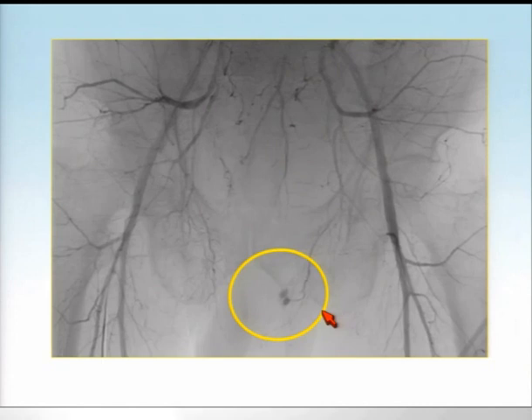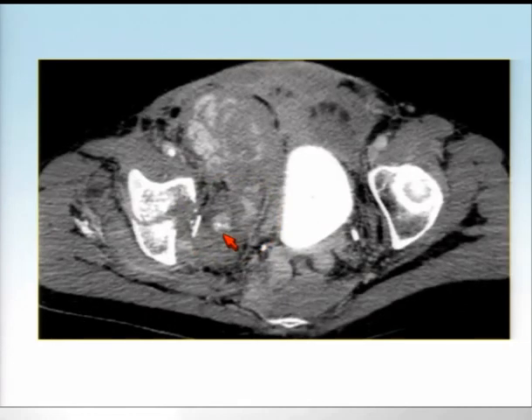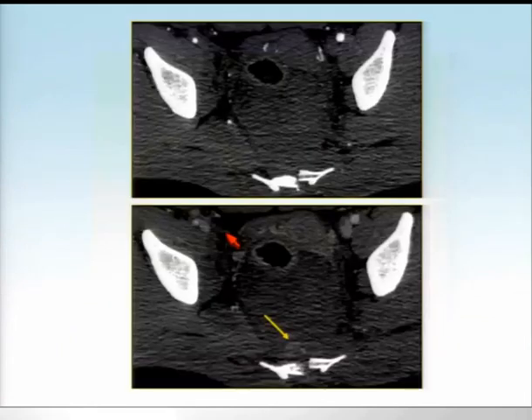This patient was successfully managed with embolization given ongoing arterial hemorrhage. Another case, similar injury on the contralateral side, again, really significant. This is a significant amount of extravasation at 25 seconds after contrast injection, and you can see that enlarge on the portal venous phase. And this patient also successfully treated for several sources of ongoing active arterial hemorrhage.